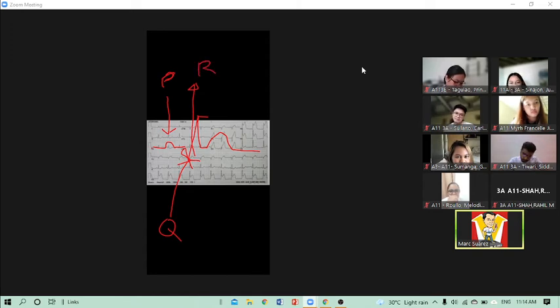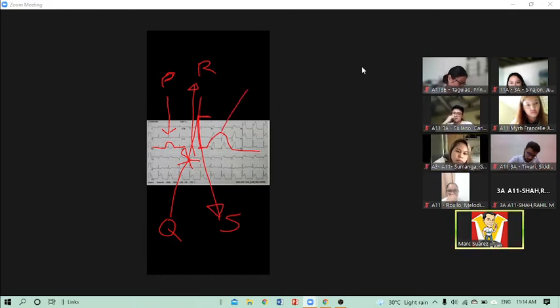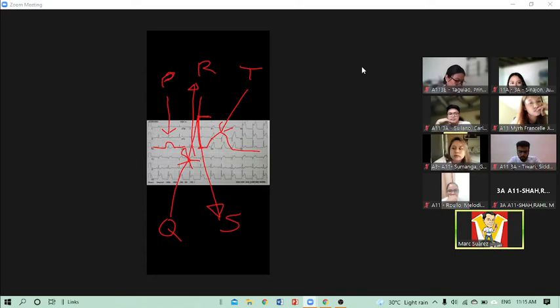This one up to here going down is the S wave. And this one finally is the T wave. Okay. Any questions? None, Doc. Do we want to do this again?